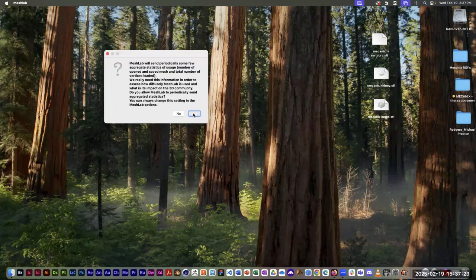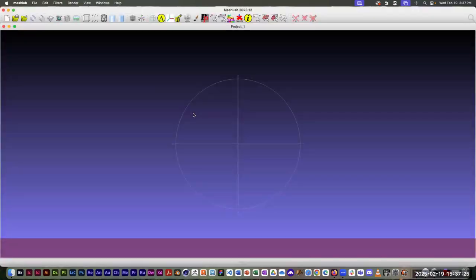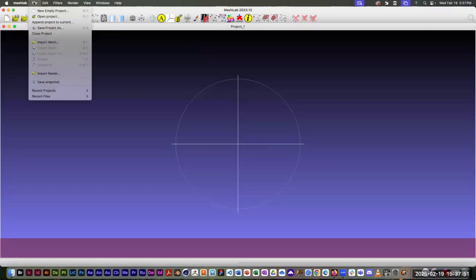All right, so this is Mesh Lab, and it's actually a handy program if you want to clean up really ugly meshes, really ugly exported 3D models. It can do things like closing holes and closing gaps in models. I like it for these kind of Horos exports because it has some smoothing functions that smooth out all the ugly ridges and things that you often get. So let me import a mesh.